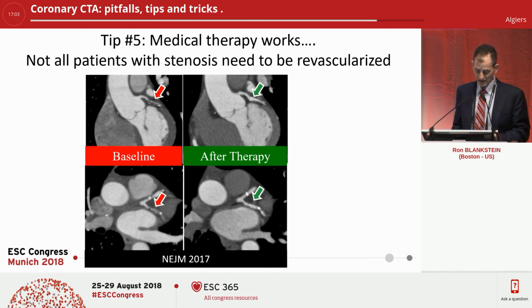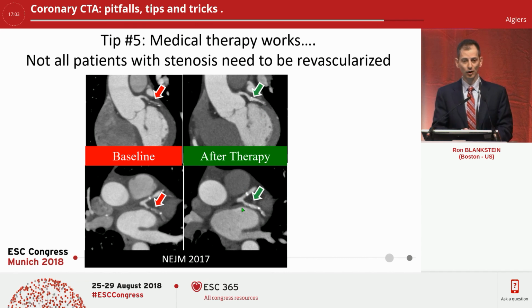And this is just an example from one of my own patients, of a patient that on the left here, you can see had a severe stenosis, mostly non-calcified plaque in the left circumflex. And after 2 years of aggressive medical therapy, not just LDL lowering, but also diet and lifestyle changes, dramatic reduction in the amount of plaque to the point that they now just have minimal stenosis on CT angiography. So reducing plaque is a good thing, but this also leads to better outcomes.